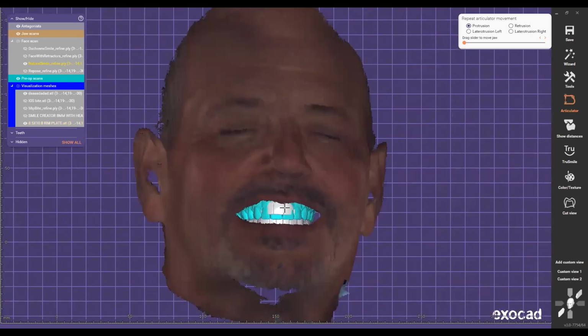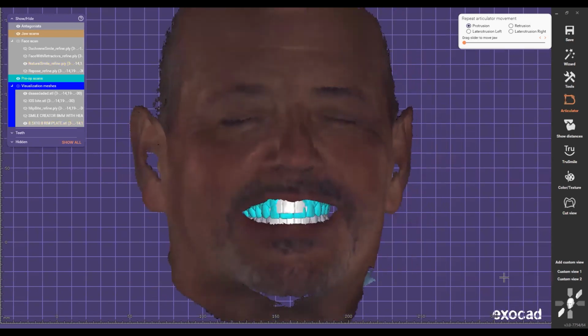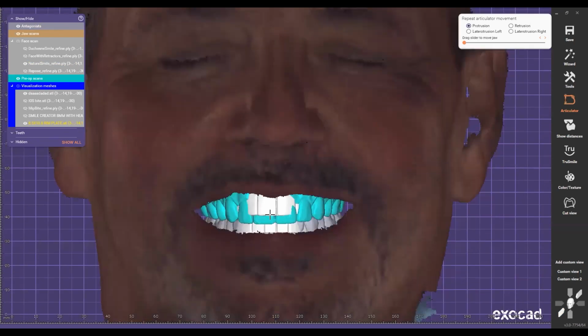And these things are basically done in expert mode. We've been talking to Exocad to make them more like a wizard mode, so that way everybody can do it. You don't have to be an expert to do this, because the wizard mode will take care of that for you. Okay, so just stay tuned on those things. That's something that is coming. So that means that it's going to be more 3D visually driven workflows, right?